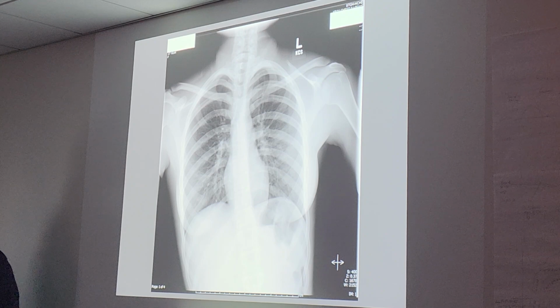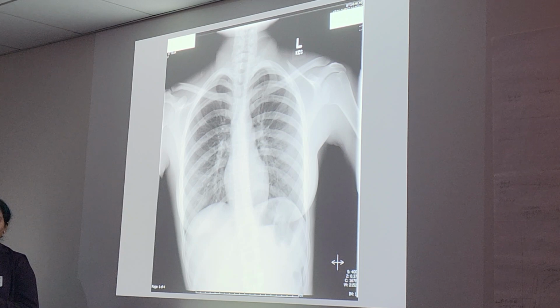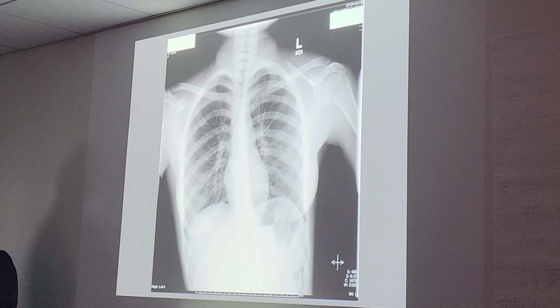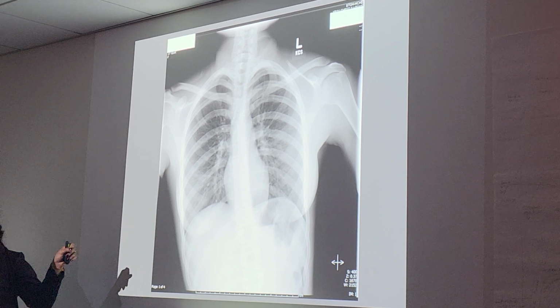If there's a space with the clavicle on the left side, then is the turning towards the left or towards the right? Towards the right. Because if you're turning it towards the left, it'll be closed. It will be open on the right. So opposite. The SC joint is whichever is touching the right arm. So if this is up, then you're looking at the right. Don't compare the SC joint with the chest. We're gonna get confused.